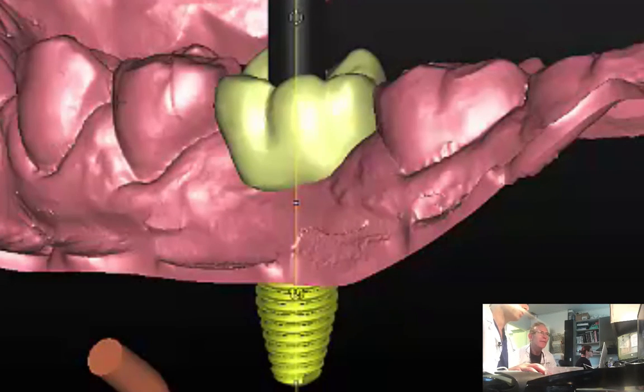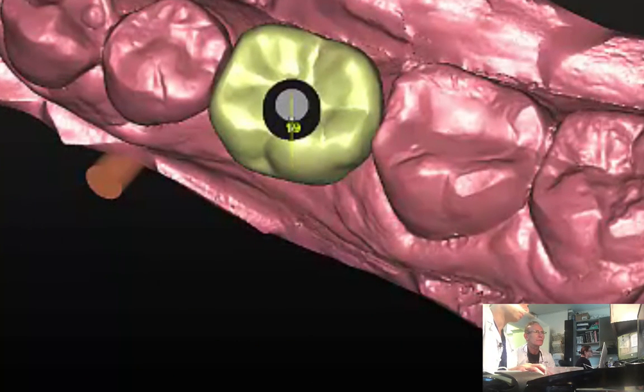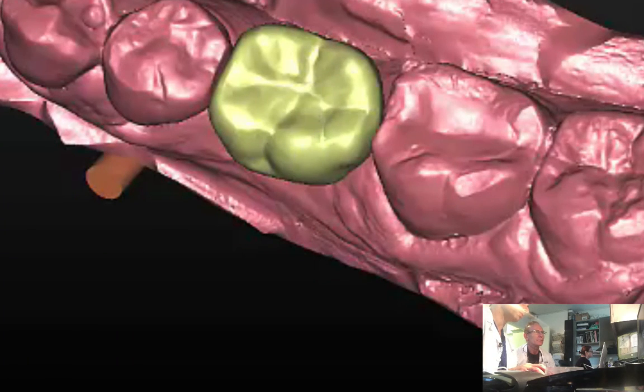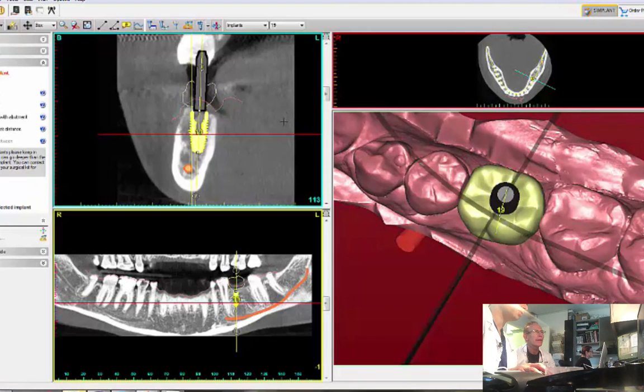Okay. So the first thing that I do, I look at this, which is now a buccolingual section. I can tell it needs to be a little bit more lingualized in terms of the angle, meaning not bodily movement, roughly.